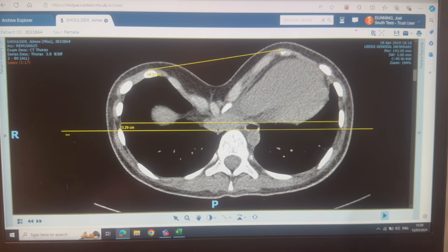Right, now I'm going to start measuring the minimum AP diameter. So it's probably just at the bottom there. You see that dips around there. So I'm going to say it starts there. And it's not very big. 12 millimeters, poor girl. And then that was AP min. This is AP max to the vertebral body, anterior vertebral body line. Put that one for the left-hand side, this one for the right-hand side. Measure these vertebral bodies.